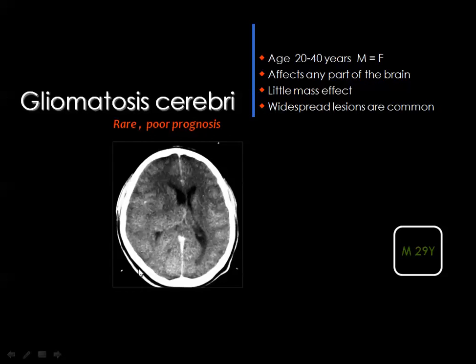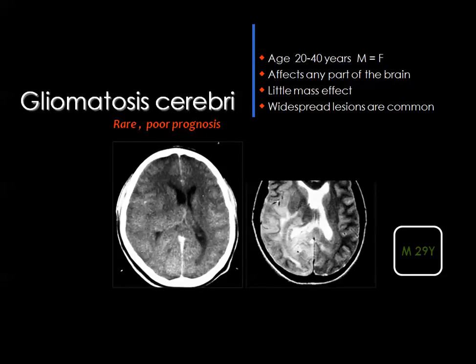And here you see this area, there is compression of the lateral ventricle, but you cannot differentiate the gray or the white matter. Look at the frontal lobes bilaterally, you can see the white matter and the gray matter. But in this particular area, you cannot see the gray-white matter differentiation because they are totally infiltrated by the tumor. But if you have the MRI images, especially in the T2 and the FLAIR-weighted images, you can see the infiltrative character of this tumor compressing the adjacent ventricle.